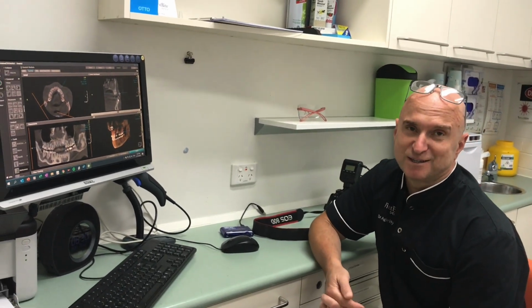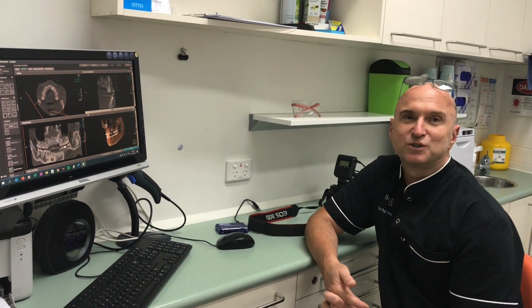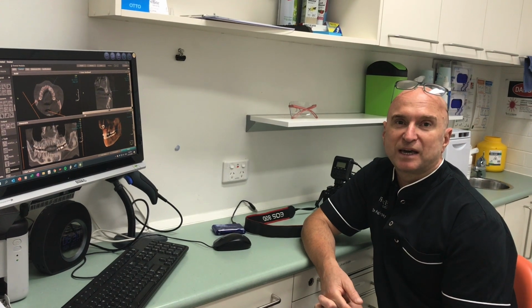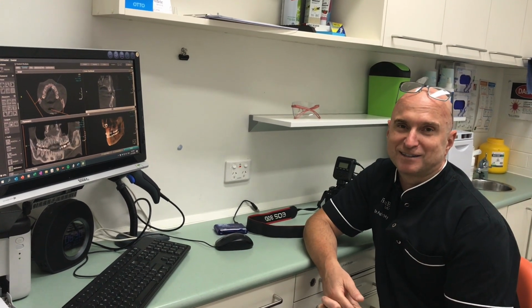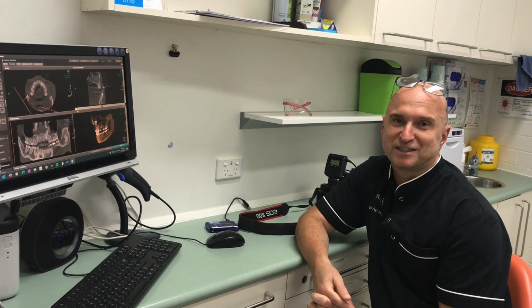And I made sure I opened up the space enough to make the exposure a bit easier. It still wasn't an easy one, but it was easier than if I'd gone in there blind trying to do it. You don't really know where they are. But that's how I was trained. That's how we always used to do it, because 30 years ago we didn't have this kind of technology.